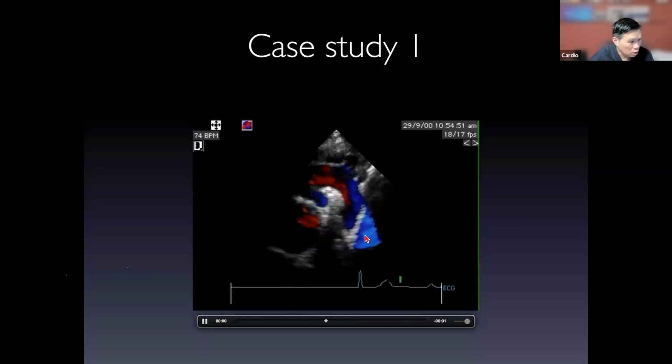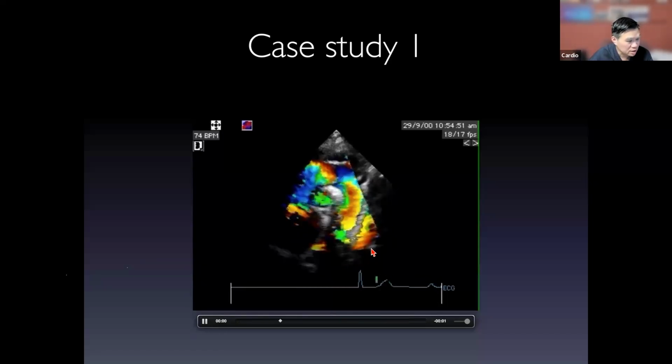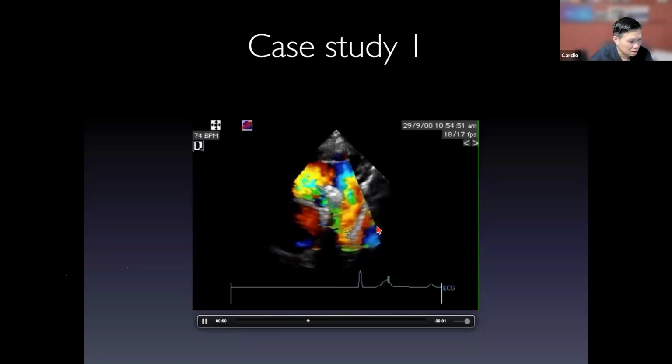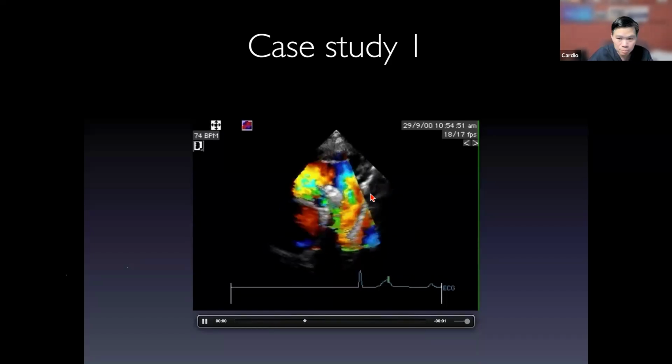This is what we call a reflection artifact, or double aorta artifact. You all know that this is not real because you know the anatomy. That's why your brain automatically filtered this out. But this is very convincing because sometimes, when you're looking for things and your brain suddenly clicks into it, you would start pontificating or wondering what this is. So this is called a double aortic artifact, or the mirror artifact.